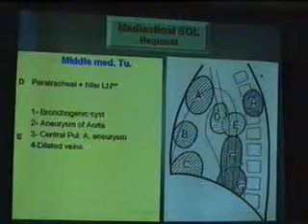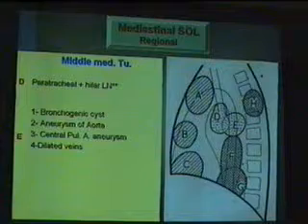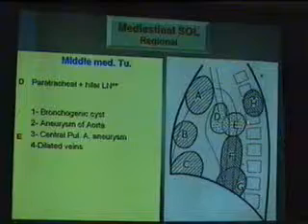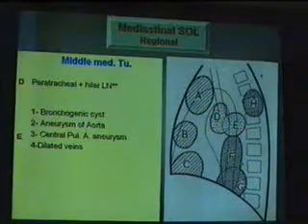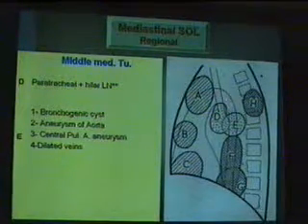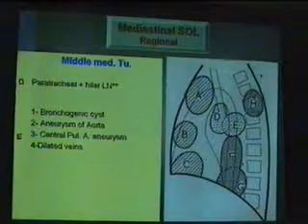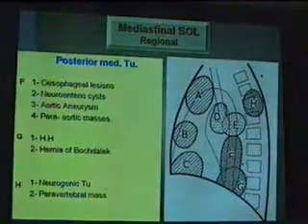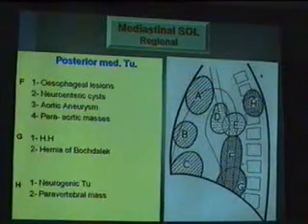فيبقى طالع منها السنترال بالمونري ارتري انيوريزم اوف ذا بالمونري ارتري، وممكن يبقى فيها دايليتد فينز. اوكي؟ يبقى تاني من الرسمه هنعرف ان this is the region of the hilum. الهايلم فيه الفلاك بالمونال، وفيه الليمفادينوباثي، وفيه البرونكس يطلع من برونكيال سيست، وفيه برضه بوستيريوري هلاقي الاورطه، فممكن يبقى فيها انيوريزم وفيها ليمفادينوباثي. لما اروح بوستيريوري بقى هلاقي بوستيريوري عندي هنا وعندي السباين.